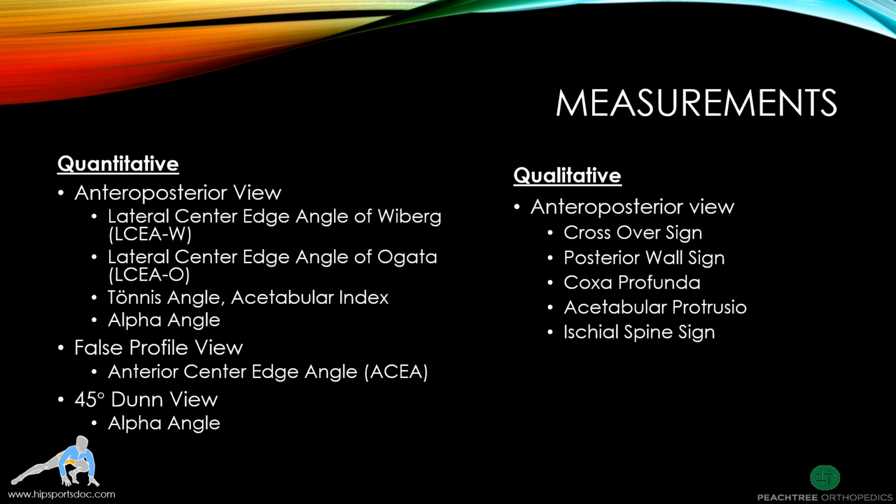This is a list of common quantitative and qualitative measurements for hip preservation surgery stratified by the radiographic view. We will review each from the perspective of the pathology that the measurement captures.